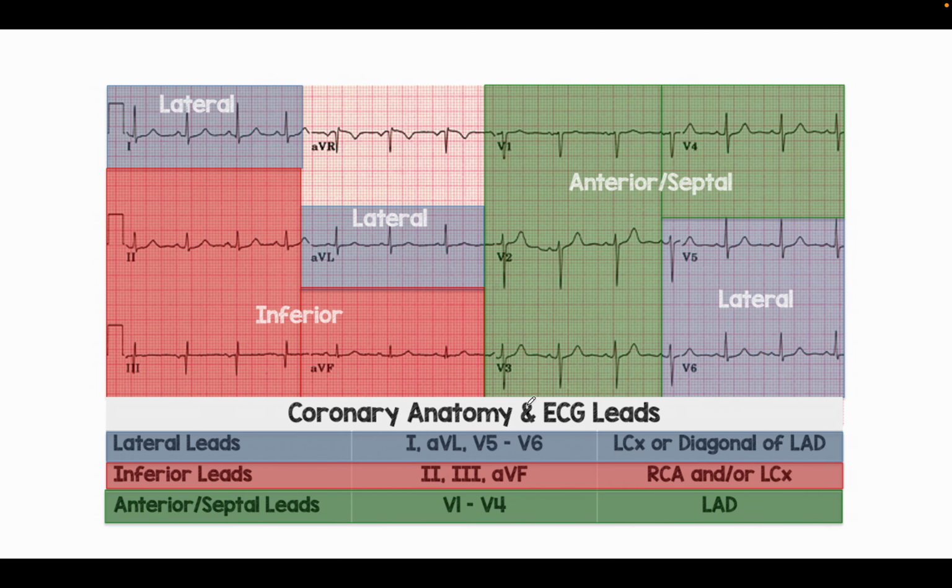And here's a nice summary that you can take a picture of or keep in memory. It's just summarising all of that.